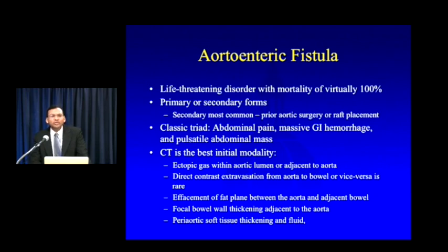What you're looking for rather is secondary findings. And the most important of those is ectopic gas either within the lumen of the aorta or immediately adjacent to the aorta with surrounding fat stranding and effacement of the fat plane between the aorta and the adjacent bowel.